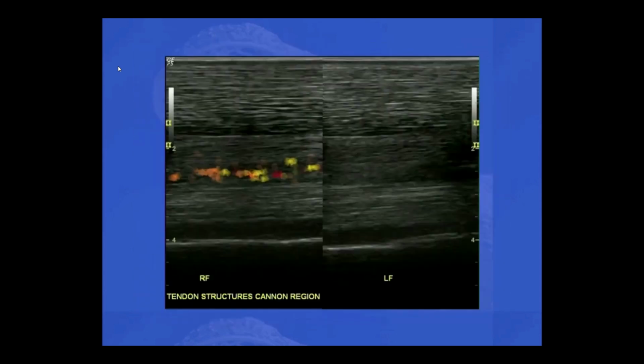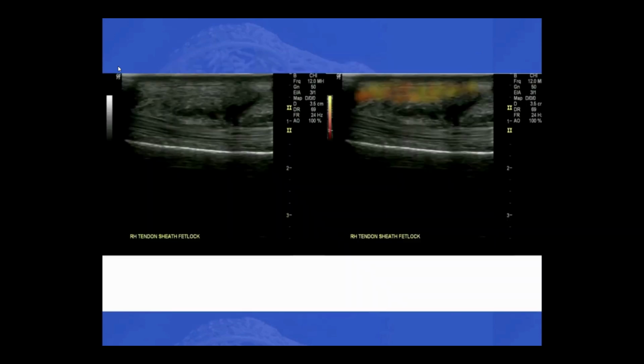Here I have an image that is a little bit more worrisome. If you get a very diffuse pattern of flow that's not really related to a blood vessel close by, that's very often an indication of real degeneration of a tendon or ligament. And so, structure-wise, you might already get that idea. Your power Doppler might really help you to make a decision in that direction.